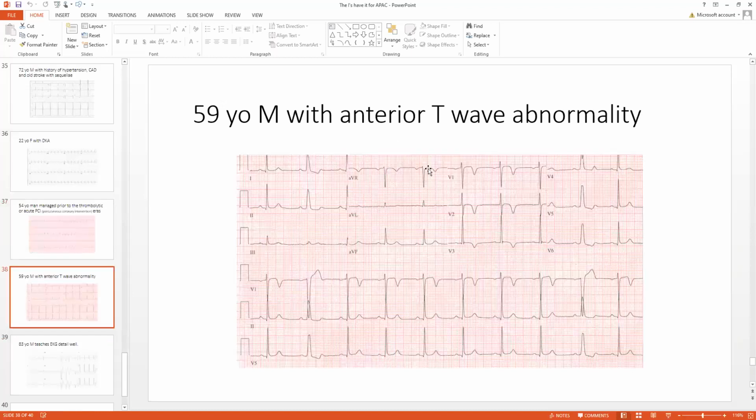All right, here's another reason for T wave changes that makes you think of ischemia, but when it follows a left bundle branch block without any change in rhythm, well, then this is called T wave memory. So you go from a left bundle branch block conduction to a narrow QRS conduction, and in the anterior leads, there's deep T wave inversion.